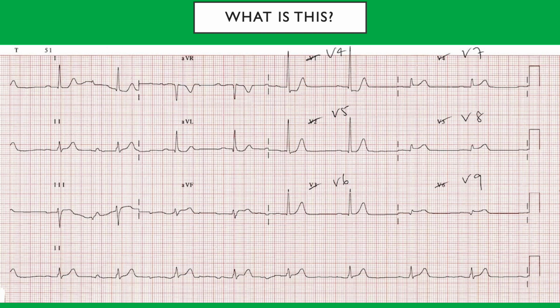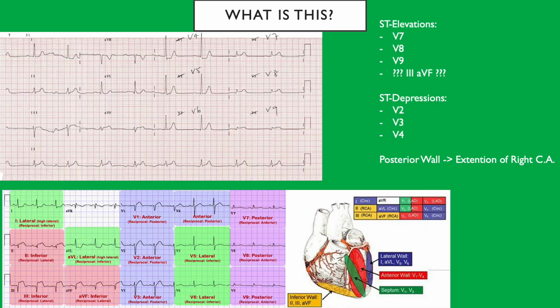Okay, so if you see ST depressions, it must be ST elevation somewhere else. If you see ST elevations, it must be ST depression somewhere else, okay? Reciprocals, mirror leads. What about suspected ischemia?